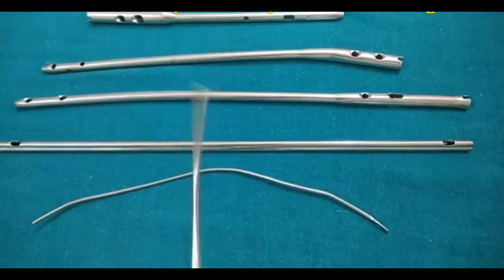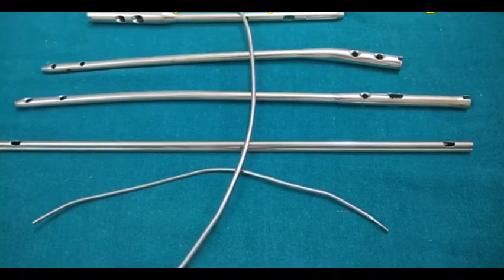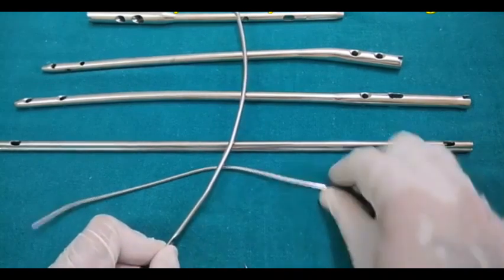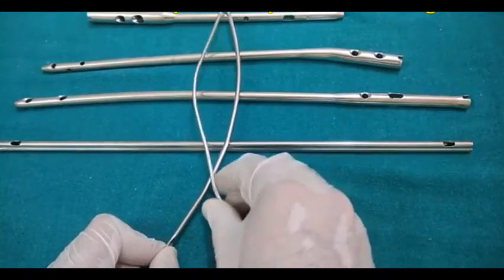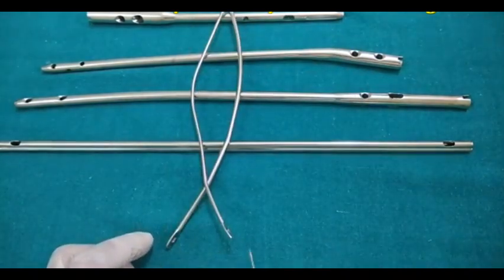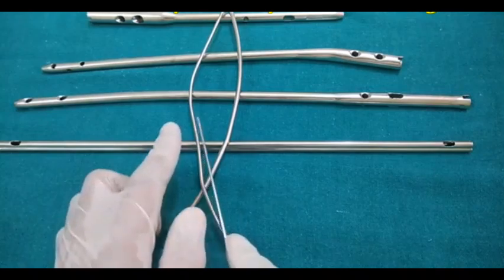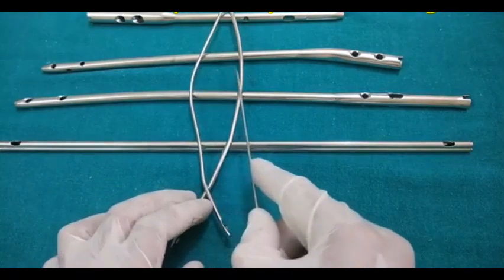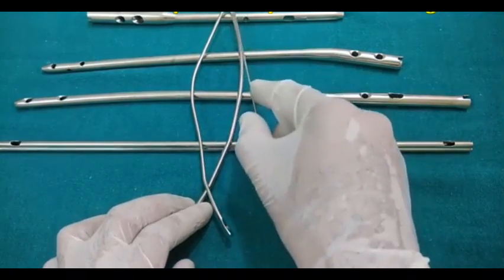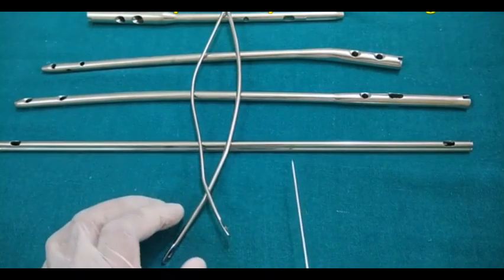Now, for example, if we want to put it in the femur, we will make an entry point over the distal femur metaphysis on the medial side and one on the lateral side. So in this way we are going to fix. Now if you assume that this is the femur, this is the distal femur, this is the medial side, this is the lateral side, we insert these two nails, we reduce the fracture, and at the fracture site the nails are wide apart and they are crossing proximal to the fracture site and distal to the fracture site.